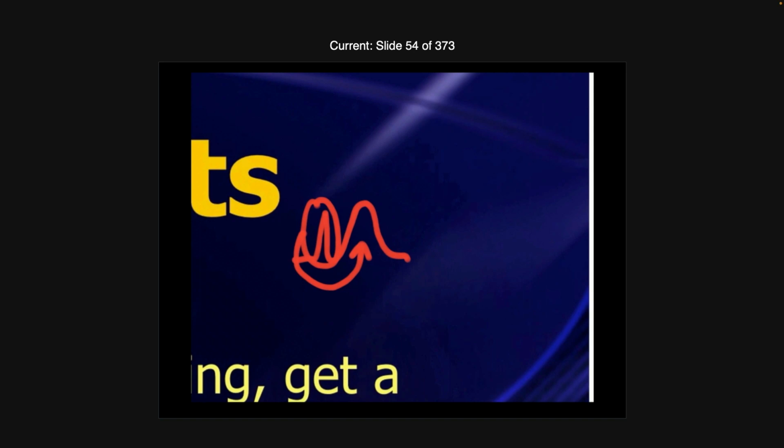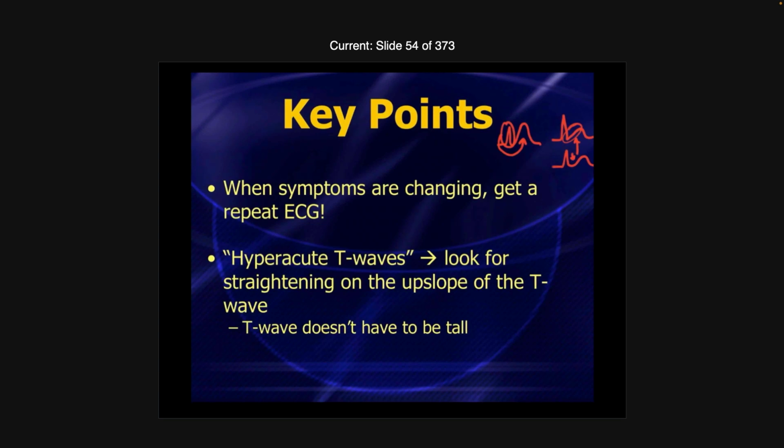But the other type of hyperacute is when the initial part of the T-wave becomes very straight, as you're seeing up here. Normally, the initial part of the T-wave is nice, gentle, concave upwards like this, but when you see straightening, even if the T-wave is not tall, you've got to really worry that that's early cardiac ischemia. Those are the two types of hyperacute T-waves that I like looking for, and that I think it's worth you all looking for as well.